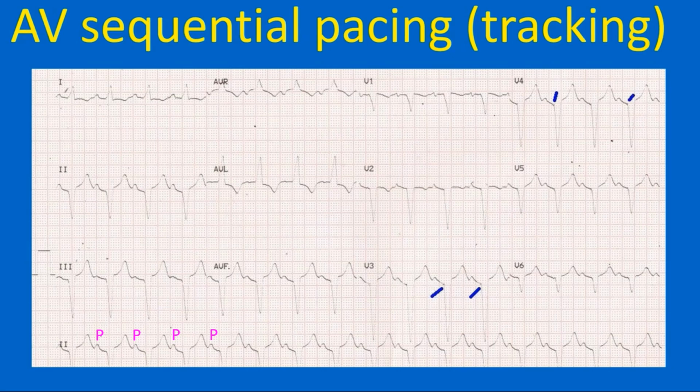At a glance, this will seem to be a simple LBBB, but the QRS complexes are negative in V5 and V6, unlike in usual LBBB. It is actually AV sequential pacing. A close scrutiny will reveal the small pacing spikes just before the QRS complexes, marked in V3 and V4.